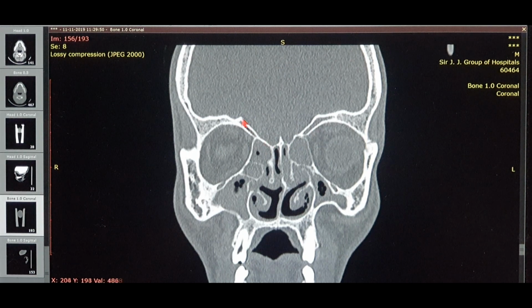So always it is the anterior ethmoidal skull base, because the posterior ethmoidal skull base is flat, like horizontal, and the anterior ethmoidal skull base has an oblique angle to the cribriform plate. So whenever you see the skull base having an acute slope like this, that's the anterior ethmoidal skull base. So always a beaking will be of the anterior ethmoidal artery.